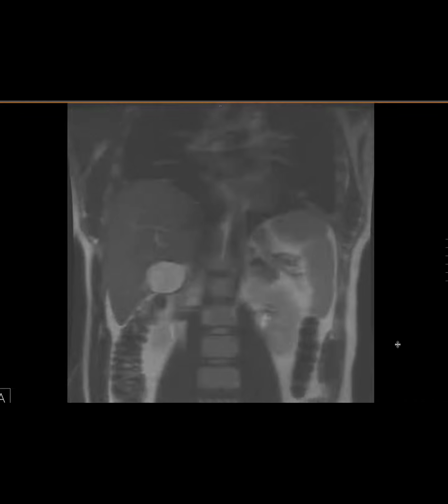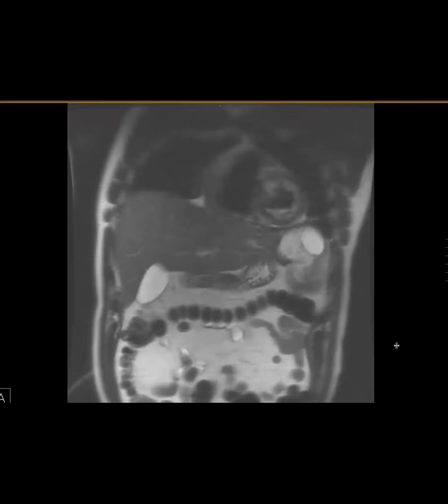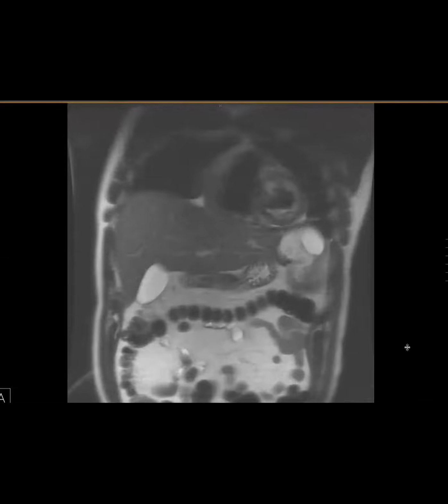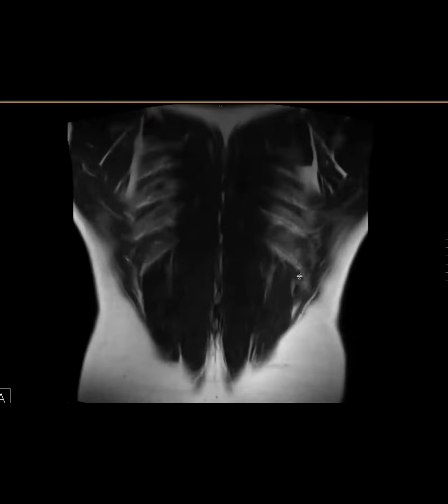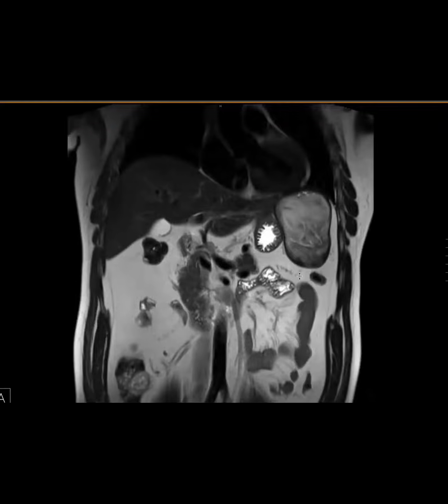Same diagnosis. Wait, this one looks totally different. Yes, like a big cystic thing hanging off the liver, with a cyst-in-cyst appearance. And let me give you the one I originally showed. That was several years later.